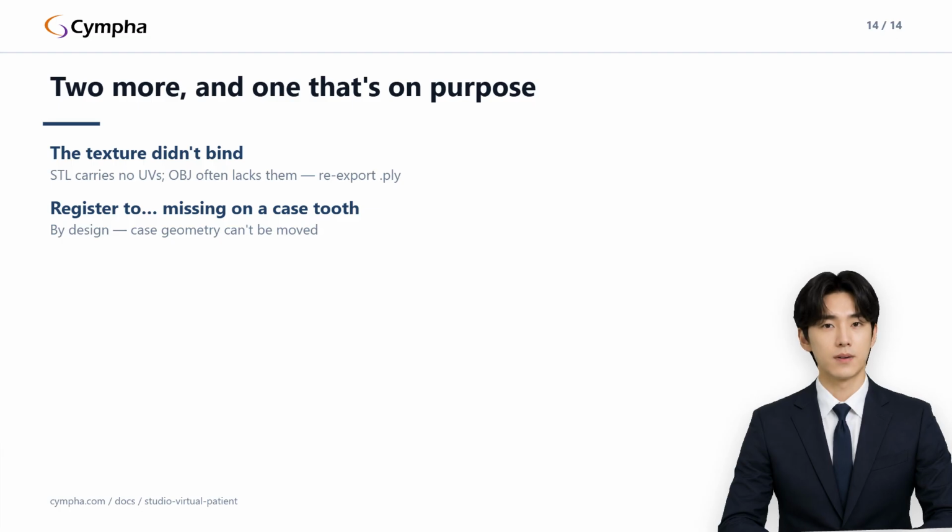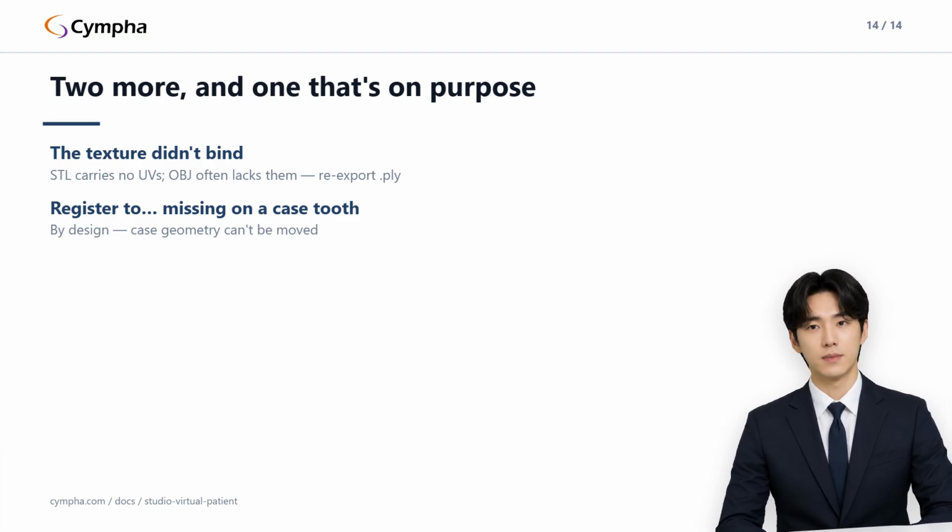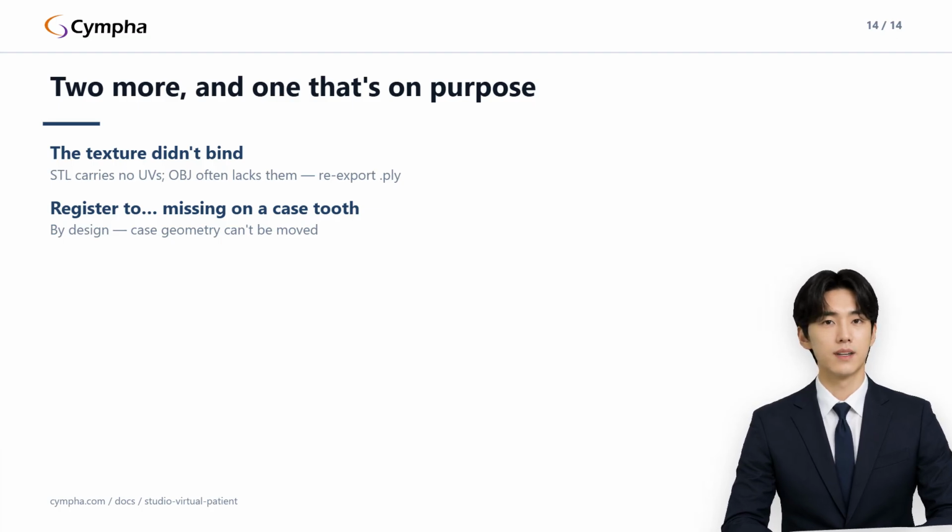and that restriction exists to protect the plan. If tooth positions in a case could be nudged by a stray registration, the plan would no longer mean what the planner intended. So when the menu item is missing on case teeth, Studio is doing its job.